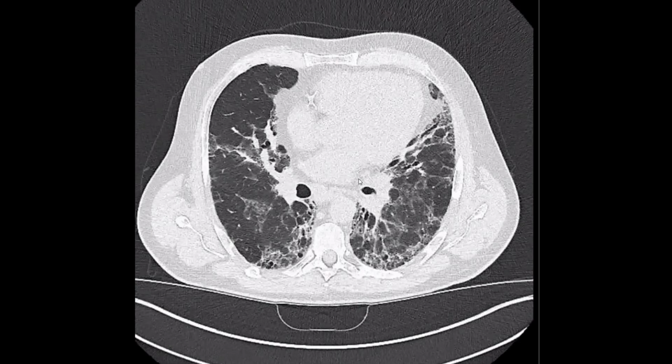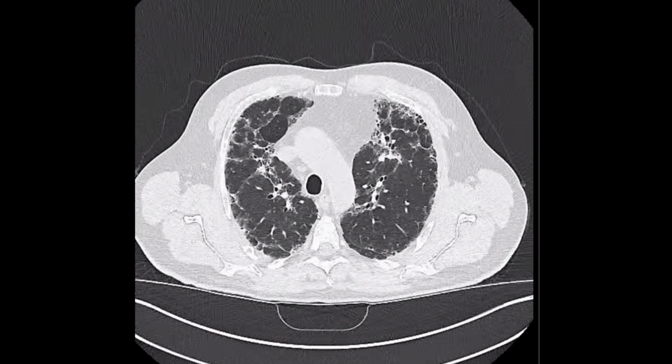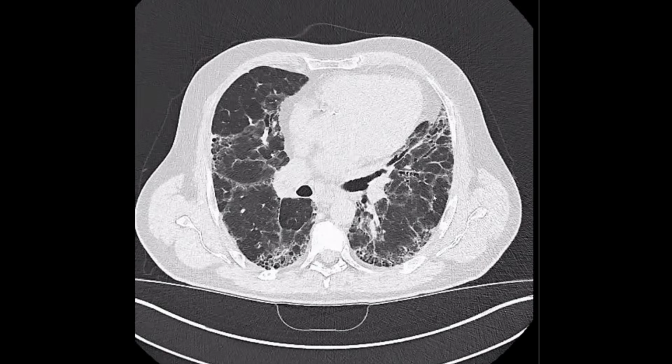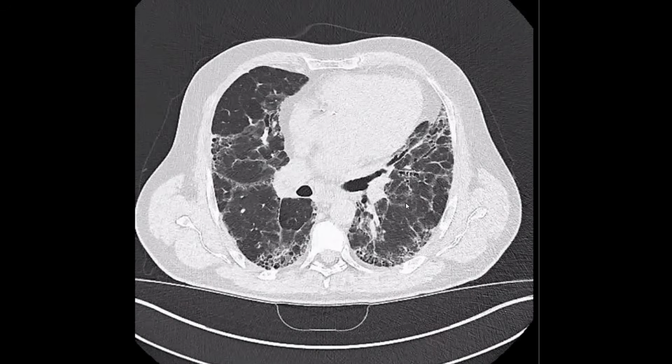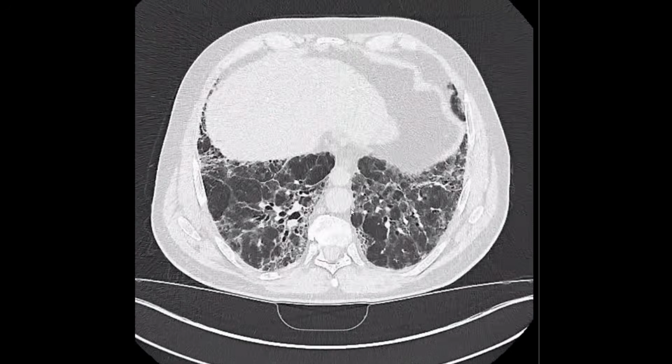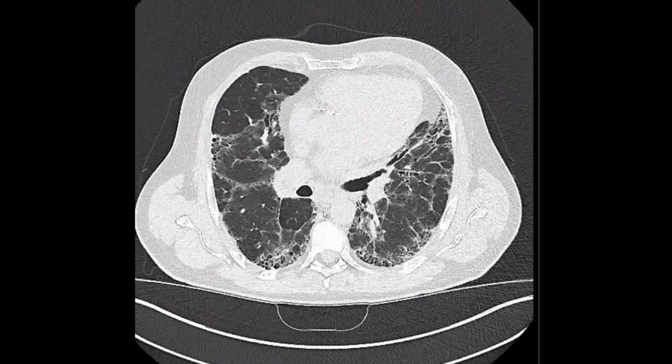The first option here is fibrotic hypersensitivity pneumonitis, and this one should be discussed with interstitial lung disease (ILD) specialists, and also you should search for an antigen. We have either extrinsic antigen or internal antigen or something. You should search for the antigen that can induce these fibrotic changes. Okay, that's fine. Thank you so much.